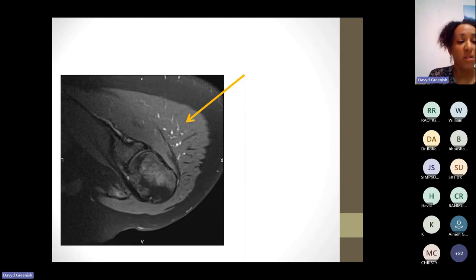So I think most of you will probably have done more radiographs than MRI. Don't freak out if you see an MRI scan. Again, same principles, orientate yourself. So what type of structure are they pointing at? This grey here is muscle. Around here, if it were pointing here, we're talking more fat. And if we're pointing here, this is bone on MR, and you can tell that it's got a nice cortex around it, which is nice and black. And also just the shape of it, you can tell that this is the humeral head because it's articulating with the glenoid here.